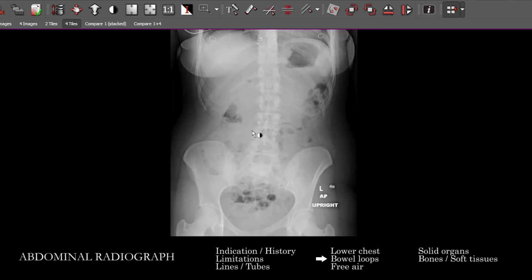And you have to figure out for yourself whether these represent just small bowel loops, or whether it includes large bowel loops. You want to figure out if any process is involved, if they're all filled with air, what is involved and to what extent you can see it. And then if you're confused about what loops are what, sometimes you can get a sense from the bowel markings, and you can check on prior imaging as well to see if there's an abnormal distribution in the abdominal cavity.